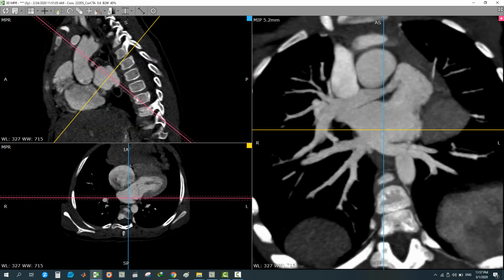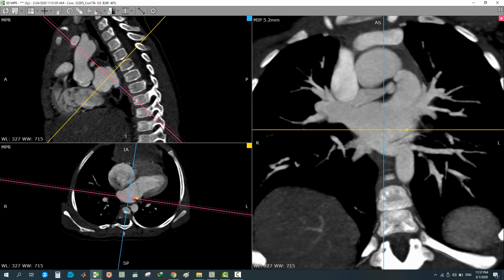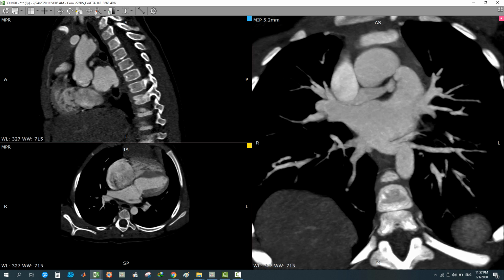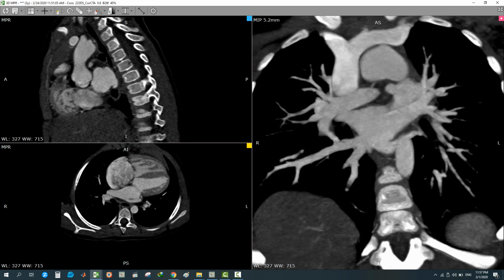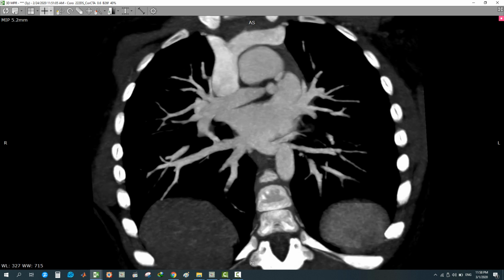But I think there is medial insertion of the left inferior pulmonary vein, just variation in the anatomy, no more, but no anomalous pulmonary venous drainage, as you see. Okay, choose this image in this way, and you can save it easily. Activate it and save it like this.